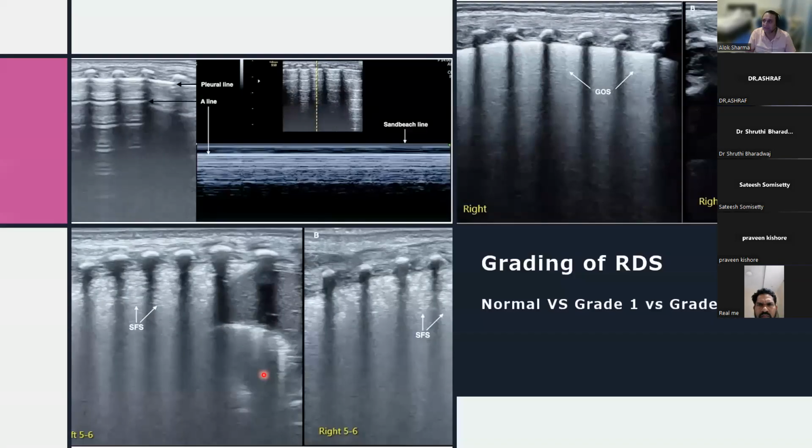Now, the question is how we make that diagnosis on ultrasound. And this is a really good example. So I want you to look at the right-hand side over here. Now, ground glass opacification, as described on lung ultrasound, characteristically doesn't quite give you the snowflake appearance. So you'll have pleura that's thick, might appear a little bit blurred. You will have these subpleural consolidations, but this is the classical snowflake appearance that you see over here. And you don't quite have that when you have a ground glass appearance.